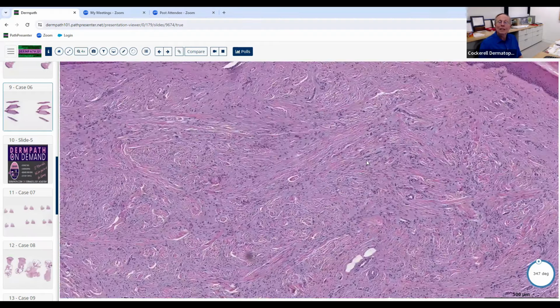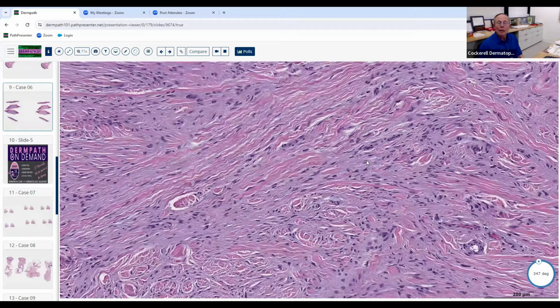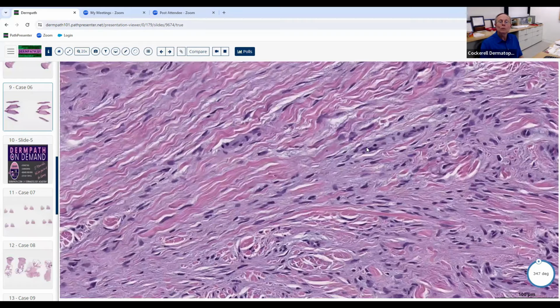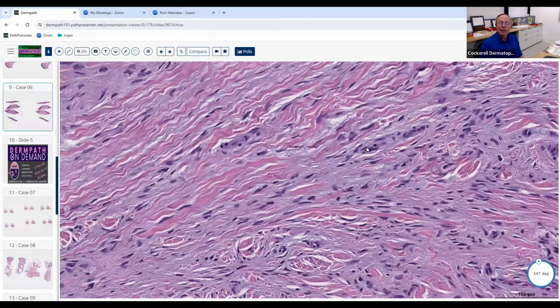And so when we see a lesion that's spindle cell and it looks like a neoplasm, the three things we think about are neural, fibrohistiocytic, and then muscle, smooth muscle. And we know if we look at the individual cell, the nuclei tend to give you characteristic morphologies. If they're smooth muscle, they tend to be kind of cigar shaped, and there's also an eosinophilic cytoplasm that goes along with the muscle cytoplasm. If they're neural, they tend to be more lazy, more delicate.